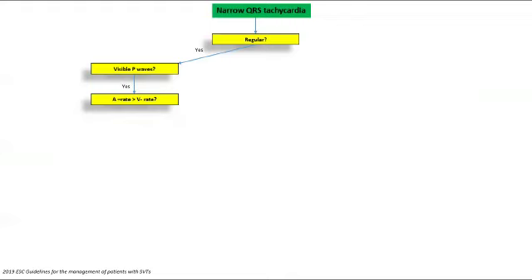If that's the case, then your differentials would be along the lines of atrial flutter, or you might be dealing with a focal atrial tachycardia, and rarely that would be AVNRT, because usually with AVNRT you have a one-to-one A to V relationship. Now, the important distinction that you have to make, especially regarding flutter and atrial tachycardia.